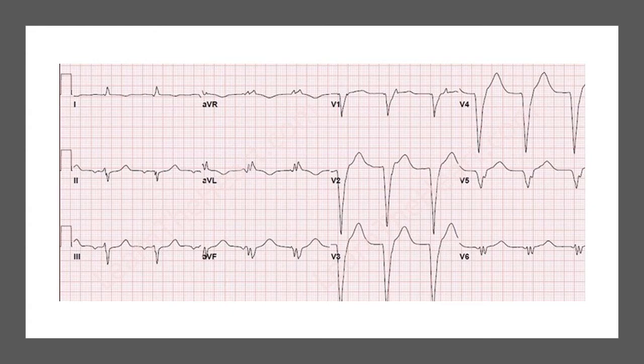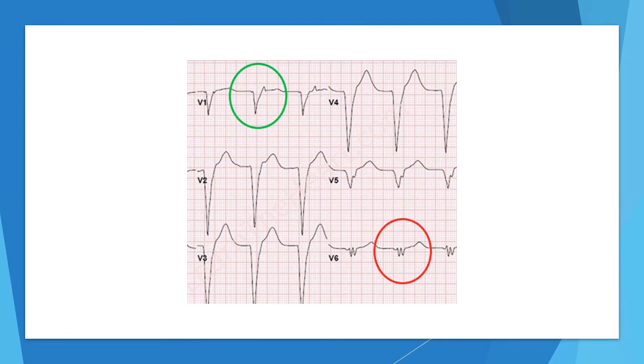This is one where if you use that trick that I was just discussing a few slides ago about driving down the ST segment, it would lead you astray. This is an idioventricular rhythm mimicking what we call a pseudo left bundle pattern. And so in this patient, if this was fast and you just assumed it was a left bundle, you might miss it, because if this is an idioventricular complex and we accelerate it too fast, that would make it monomorphic VTAC, in which case your pharmaceutical treatment regimen would change.